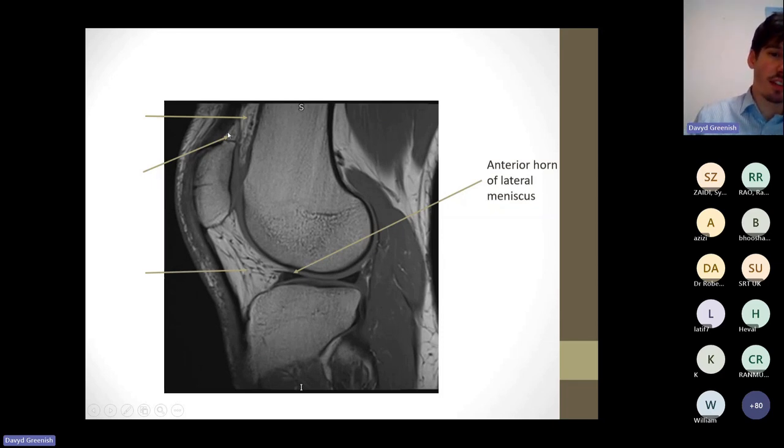There are 3 structures here. These are all fat pads. Do people just want to say which 3 fat pads these are? I suspect you may have come across that one. You may not be aware of the fact that there are these other 2 here, potentially.